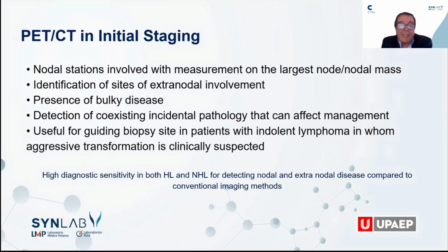In the initial staging with PET-CT, we can detect the nodal stations involved, identify extranodal involvement, and detect bulky disease and also incidental pathology that can affect patient management. Moreover, it can also be useful to define the site for the biopsy with the least invasive intervention.